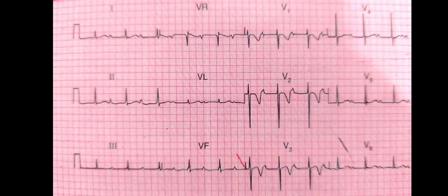Alright, it is very good to practice random ECGs, because when you practice random ECGs, it becomes easier for you to find the findings on the real ECGs that you will get in your exams. Even on YouTube and various sites you can find ECGs that are already labeled, and you are unable to practice unlabeled, random ECGs. Like if you want to study left bundle branch block, you just search and get the ECGs of left bundle branch blocks, but at that time you already know that it's a case of LBBB.